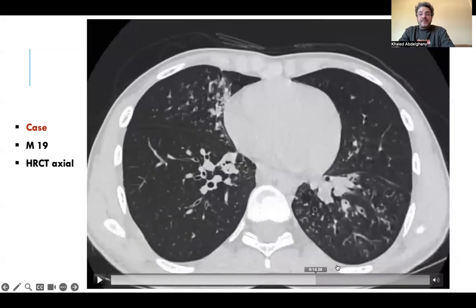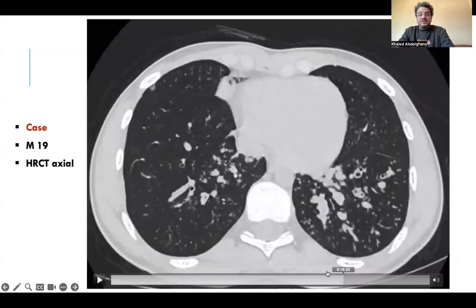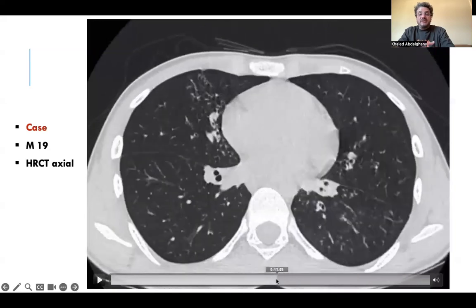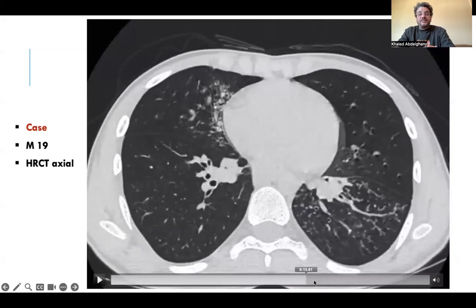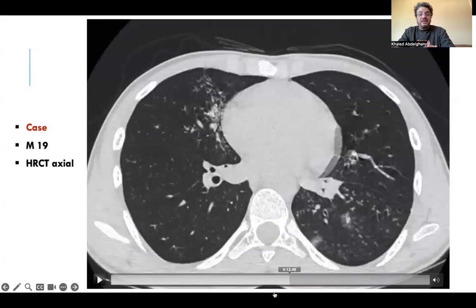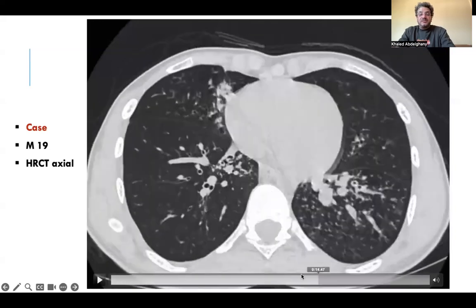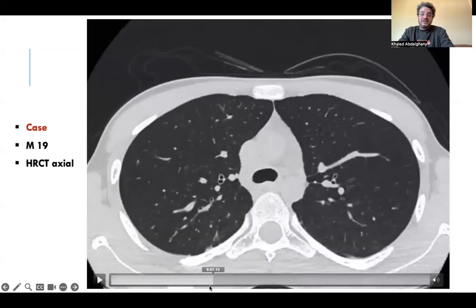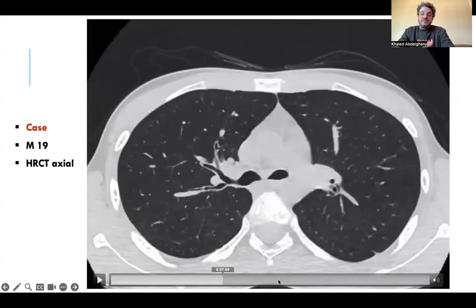You shouldn't be just mentioning the infection, as everyone can diagnose this as infection. The point is that you are thinking of what is underlying. Presence of bilateral, lower lobar, right middle lobe tree-in-bud, bronchial wall thickening, bronchial dilatation, mucus plugging should highlight, in this age, especially if it is repeated infection, that there is something underlying to cause this repeated infection, particularly when paranasal sinuses are requested. And even without a PNS request, these three entities should be in the differential diagnosis.